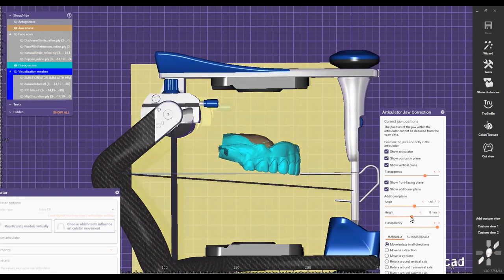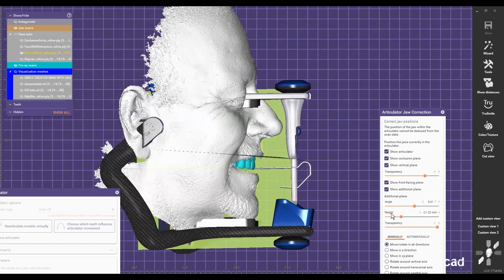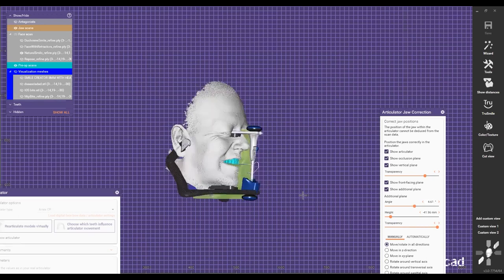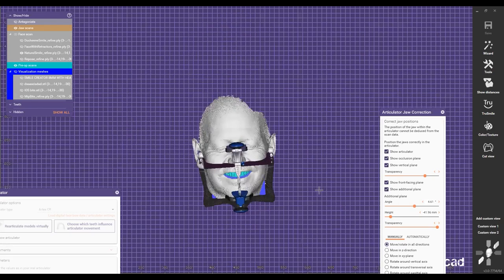I can just come and start looking for the information here for the proper angle, right? I can just do this, the Ala-tragus line and all that. I can do that. But for me, I don't like to use this one. So I have my own guidelines that I'm going to use for this case.